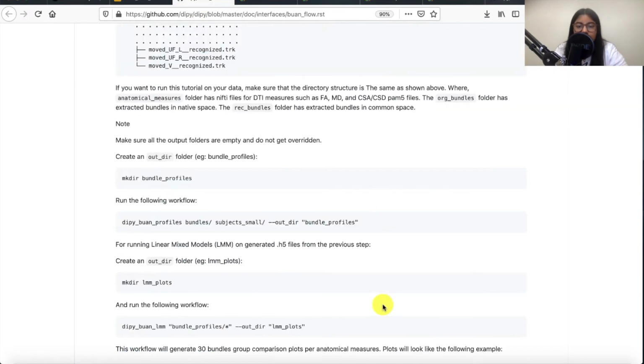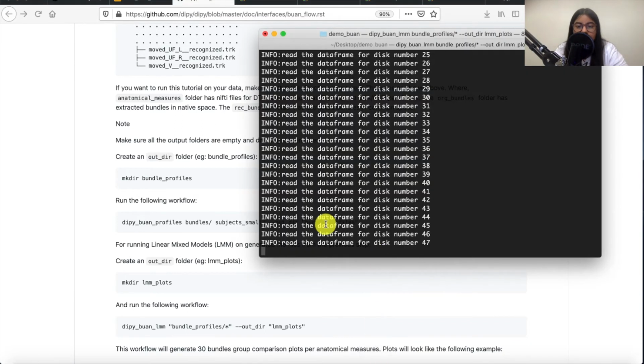Let's go back to here. So we are at 48. I just want to mention the data we have here. We have a very rich representation of data. We have many points on streamlines, and we're using all the streamlines and all the points. That's why it may be taking a bit of time, but it's a lot of data to process.